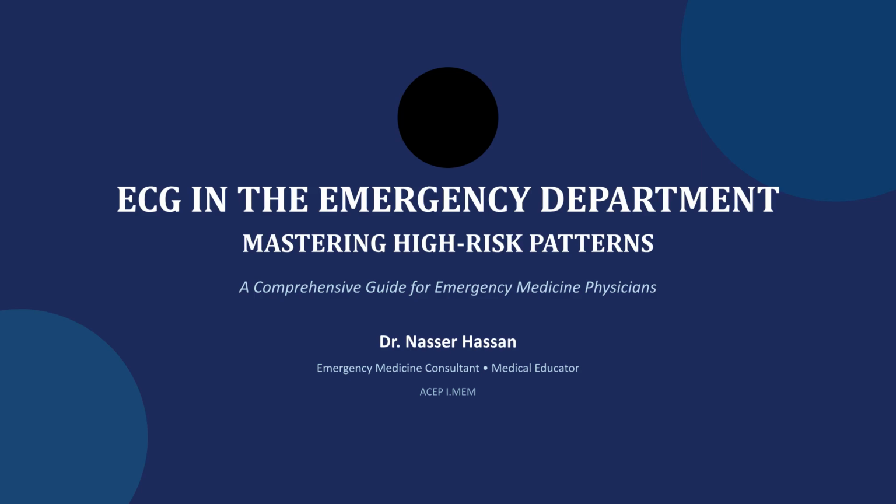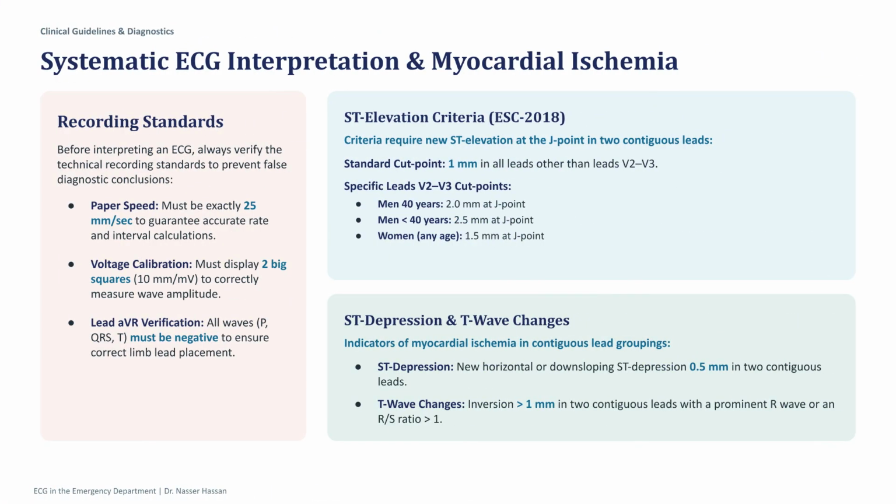Welcome to this video on ECG interpretation in the emergency department, focusing on mastering high-risk patterns. This guide is designed for emergency medicine physicians. Before interpreting an ECG, ensure technical accuracy.